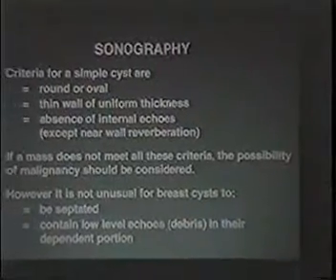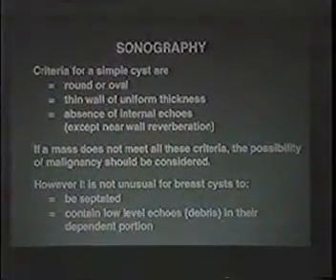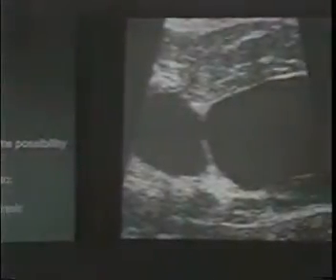And this is a woman who you can see has this big mass up here, and she has the second mass here. Its margins are not really well defined. Some of them are, but some of them are obscured by adjacent tissue, and 2 of them, at least 2 of them here. We cannot make the diagnosis of this being a cyst on the basis of the mammogram. So what we do is we go ahead and do a sonogram unless it's palpable and the surgeon wants to just aspirate it to determine what it is. And on the sonogram in this particular case, we saw this, and we saw this, 2 obvious cysts.